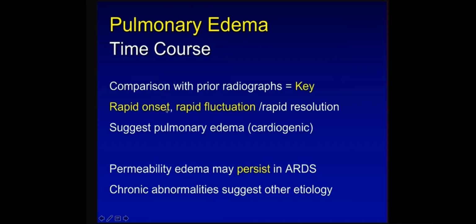So time course is very important. The prior studies are really your best friend in terms of recognizing pulmonary edema. And you'll look for a rapid onset and rapid change in the radiograph. And that does suggest a cardiogenic type of pulmonary edema.